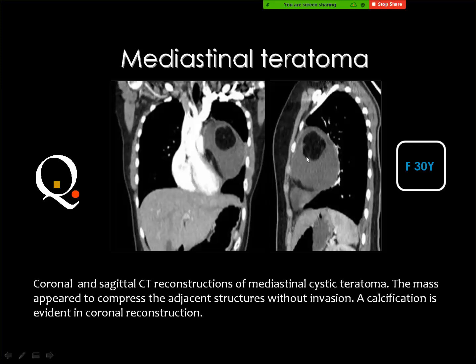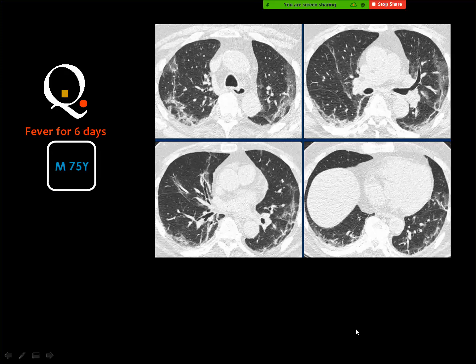If you see fat inside a mass and you are not sure, consider it as mediastinal pathology, because there are no masses in the lung containing gross fat, unless extremely rare, and is usually diagnosed by biopsy.